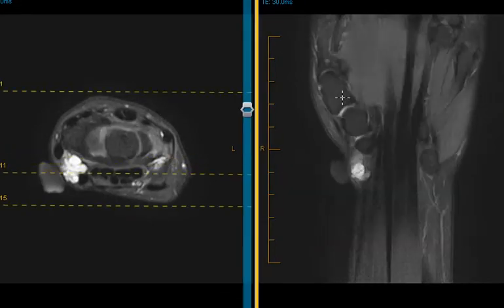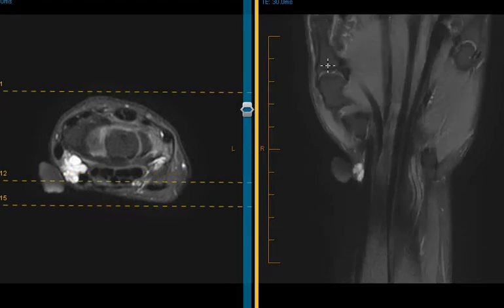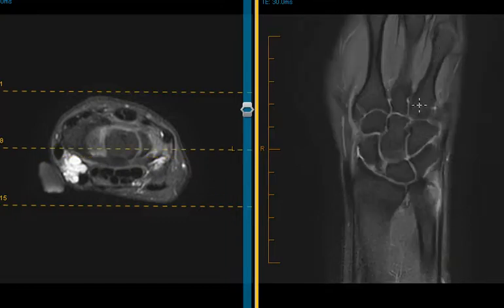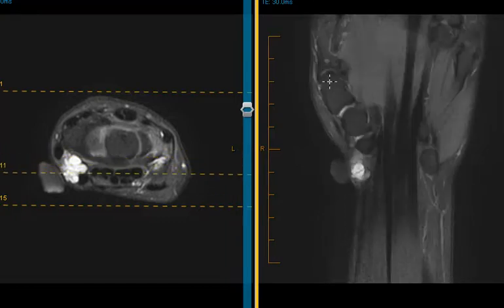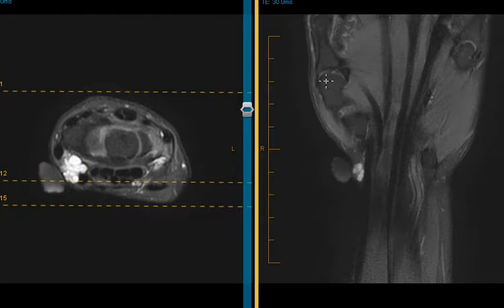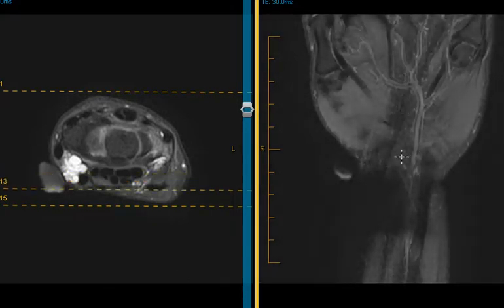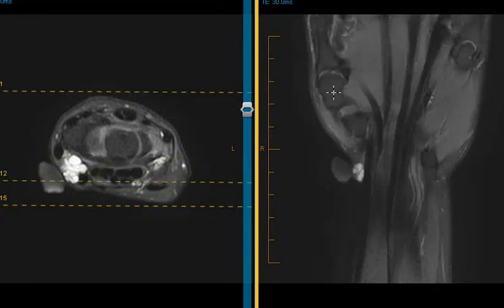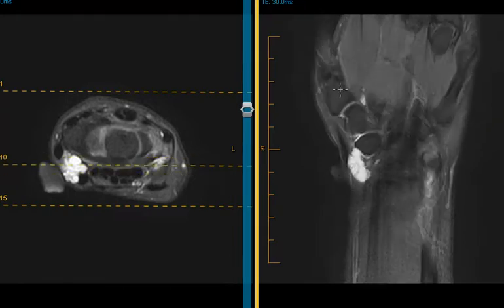We can see over here the base of the thumb. Here's the thumb. This is the first metacarpal bone. It's really short, and the fifth one here maybe a little bit short, and the fourth one here maybe a little bit short. So the fourth, fifth, and then mostly the first metacarpal, which is very, very short. This is a benign developmental abnormality, usually a chromosomal abnormality. You can also see it with other things like Turner syndrome, and this is just an incidental finding here, easily found on x-rays or just on clinical examination.